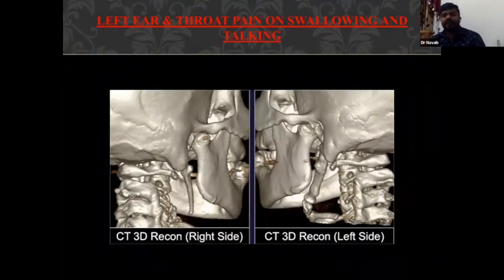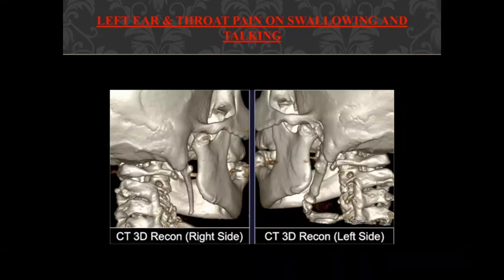So this is the last case. The patient presented with pain in the throat and all. What are you seeing on the 3D images? Elongation of the styloid process, likely Eagle syndrome. Okay.